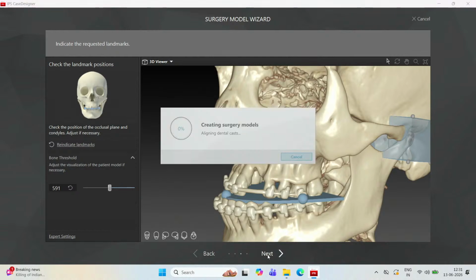Once you're done with that, you can move on to the next.